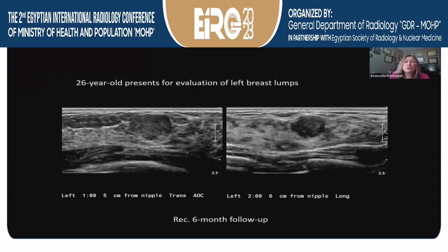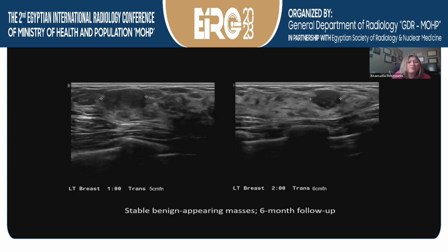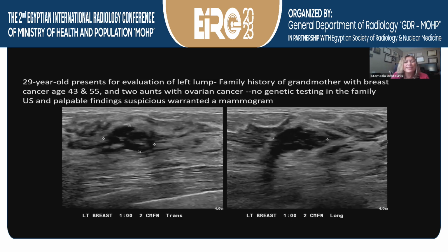This is a patient that's 26 with benign masses in her left breast. We do 6-month follow-up looking for stability, and then they're stable. We bring them back again, and then a year later to complete a 2-year follow-up.